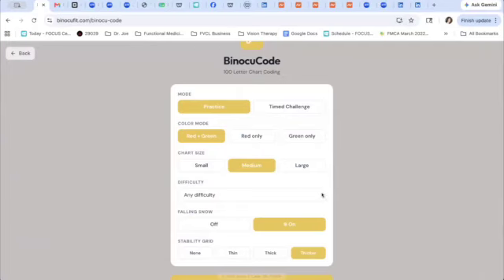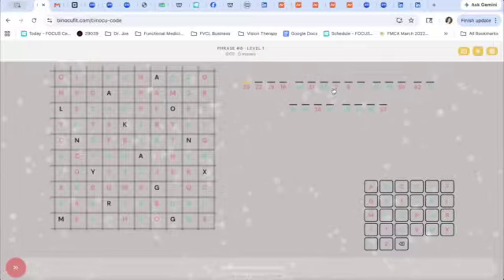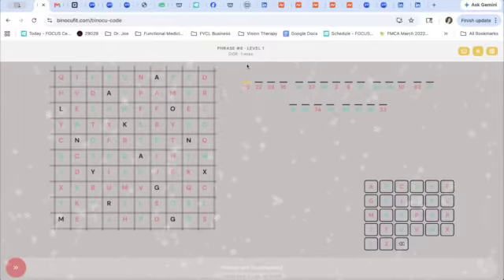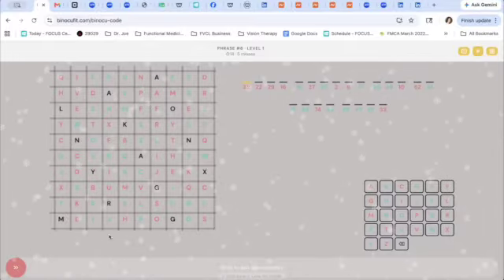There are difficulty levels. If I put it on the easiest difficulty, then it's only going to have a couple words in there. And you see this at the top where it says misses. If I click one, it records that I missed one, right? So I know how accurate they're being with their decisions based on how many misses they stack up as they're doing it.